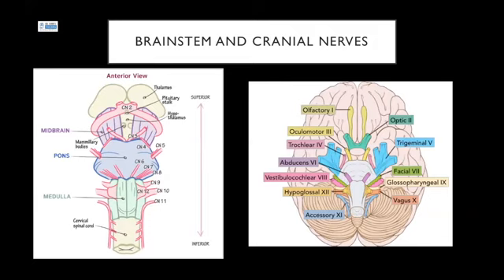And the cranial nerves are numbered by their location on the brainstem, going from superior to inferior. Some of the cranial nerves can be very difficult to visualize on standard MRI sequences, and thin slice, high resolution special sequences on a 3T scanner are often required. Even with these special sequences, some of the cranial nerves are small and are still difficult to appreciate.